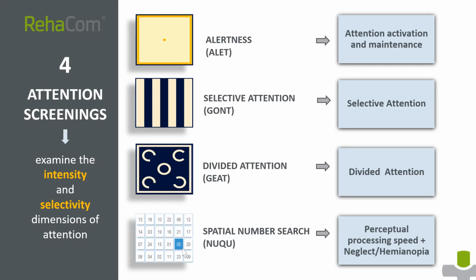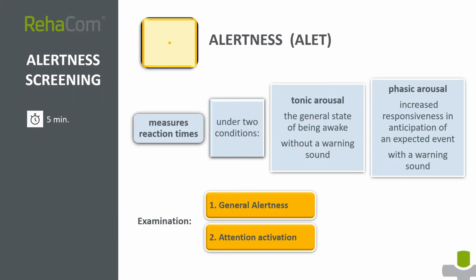The first screening is the alertness screening. Alertness is the basis for any attention performance and therefore the precondition for adequate action. This screening measures reaction times. The reaction times are measured under two conditions.